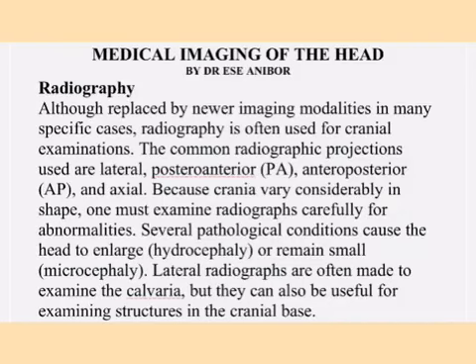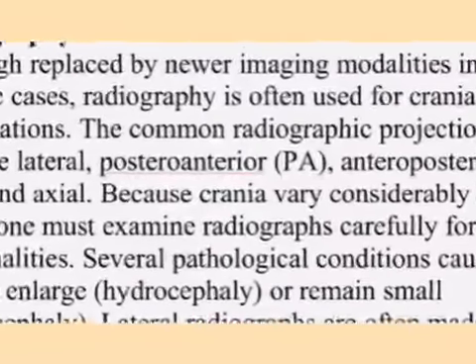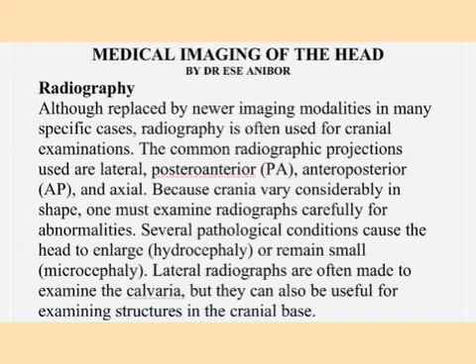The topic is medical imaging of the head. Let me start with radiography. Radiography is an old imaging modality. Though you have newer imaging modalities, radiography is still commonly used for cranial examinations.